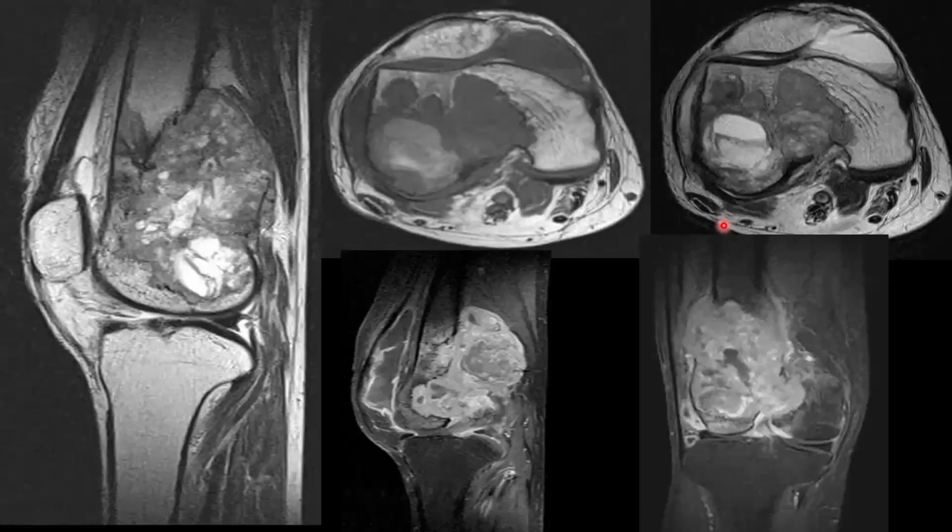So this patient underwent MRI. This is the sagittal T2 MR image, T1 and axial T2 MR images. Here we are getting an eccentrically located soft tissue mass lesion. See that the lesion extends inferiorly to the joint space, or the subarticular area. So involvement of the joint space or subarticular extension is more in favor of giant cell tumor. And the soft tissue lesion shows heterogeneous enhancement with some areas of necrosis.